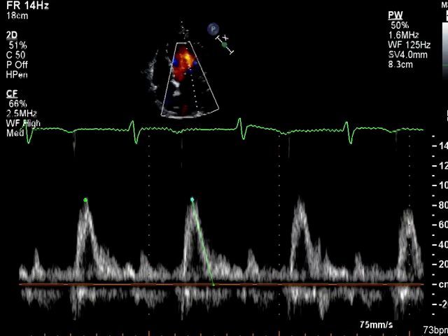Now, this patient underwent an atrial fibrillation ablation the day previously, so the rhythm has regularized. And I think on the 12-lead electrocardiogram, you could actually see small P waves. In this tracing, you don't. Certainly, you don't see any A waves in the pulse wave Dopplers through the mitral valve, suggesting no organized atrial systole quite yet. Again, they're only one day away from ablation. You can see the peak velocity of the E wave is almost 0.9 meters per second. The deceleration time of the flow is short at only 170 milliseconds.